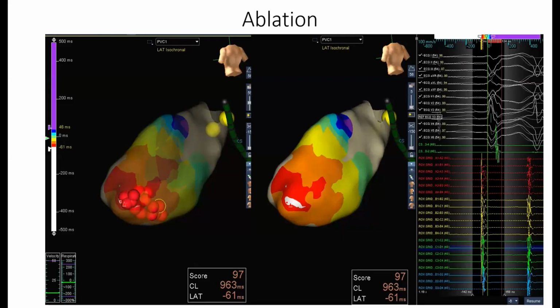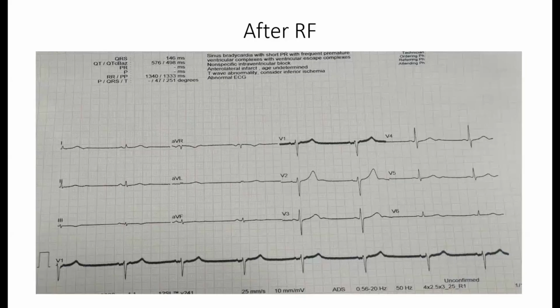Okay? So this would not be something that I expect to see in a patient with MAD scar disease. MAD scar disease is usually superior to the papillary muscle, okay, not below. So perhaps this patient had a mitral valve annular disjunction, but the PVC focus was probably below the papillary muscle. That's what I can say, okay?